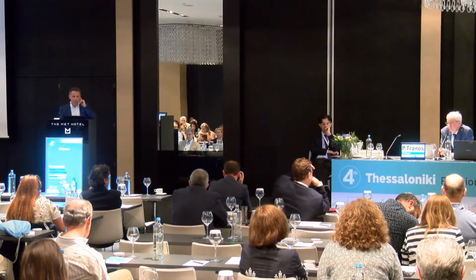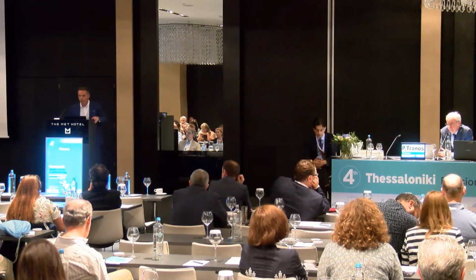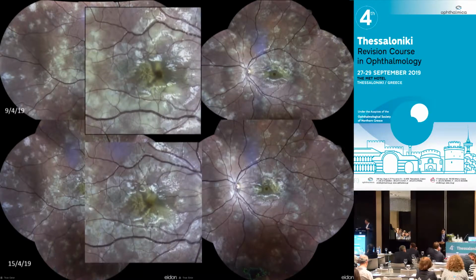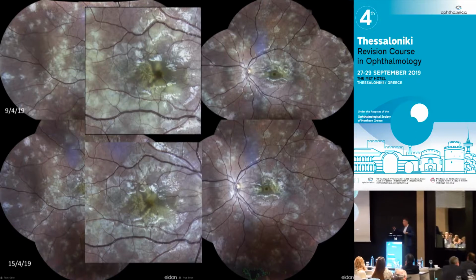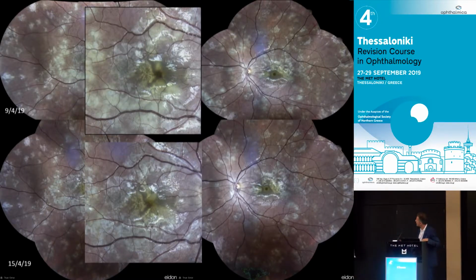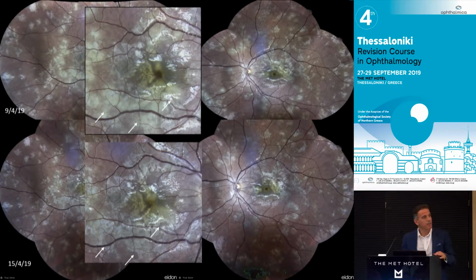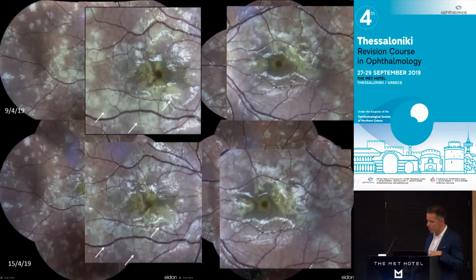Let me just show you how it evolves. So 1 week later, we have lesions of different age. And we can see lesions that fade out. I mean, that's very typical for AMPPE, and it's a bit quick for TB to get new lesions. But there are still new lesions, though, in the left eye. Yeah. And there is progression towards the fovea. That's the most worrying thing.